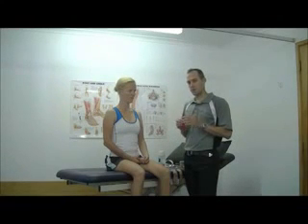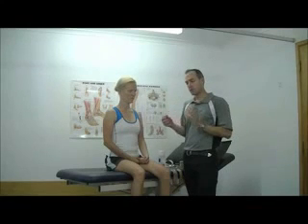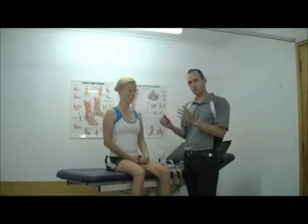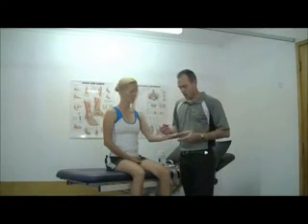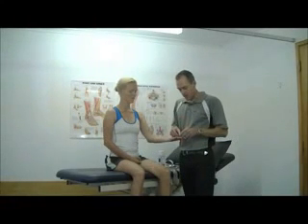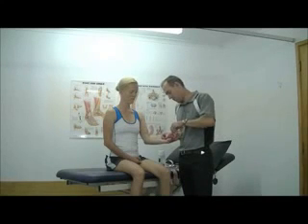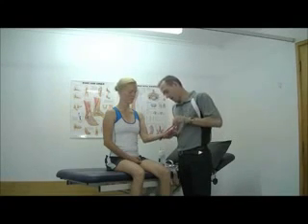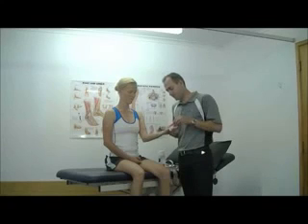If we do look at it as a mechanical tape, or a strongly mechanical tape as we do with a dynamic tape, you see there are some important differences. So the tapes all have different aims and therefore different indications for use. The skill of the practitioner is to determine which tape to use in what situation to get the best for their patients. Now, if we take a piece of kinesio tape and we actually apply it in the inner range, so with shortening, with some stretch on it, what we will find is that rigid endpoint is at some point going to limit the range of movement.